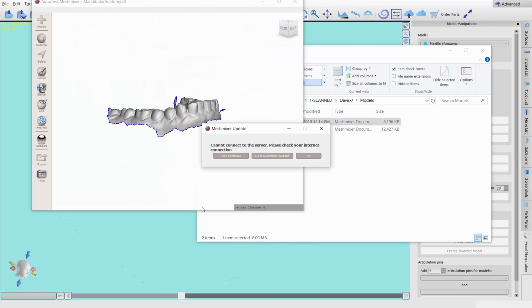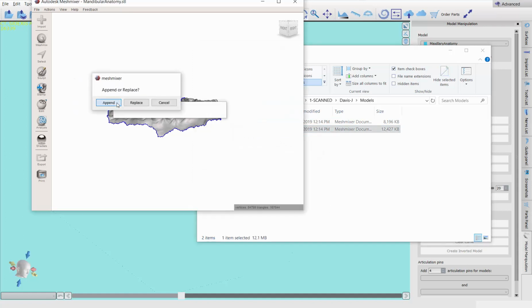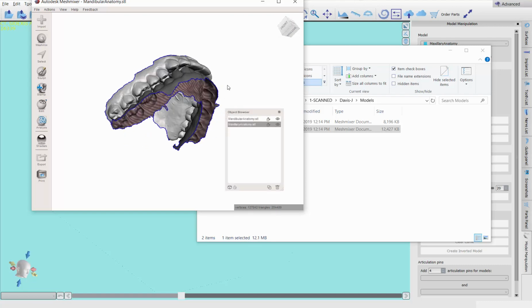So when I bring them into, sorry, let me finish that thought so you can see, so I'm not just talking over myself and you're trying to figure out what's going on. So you can see they're in occlusion.